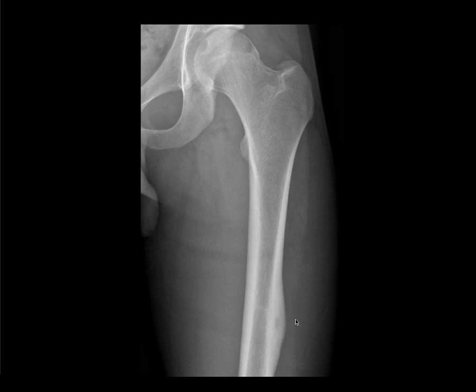in other examples. So in this case you can see a lucency in the center of the area of periosteal reaction in the cortex, and with this appearance we might suspect that this was due to an osteoid osteoma, which nobody knows quite what it is, but it's some sort of fibrovascular proliferation within the bone which causes an adjacent periosteal reaction.